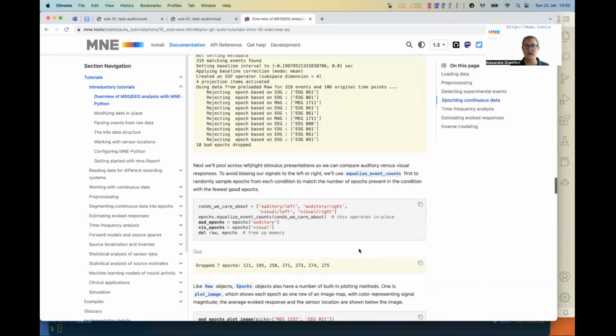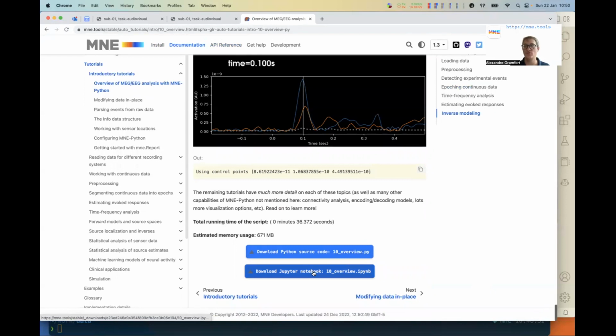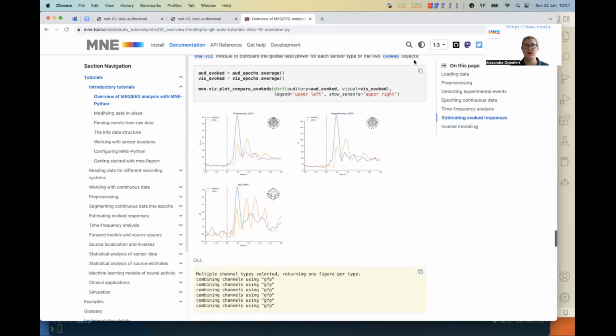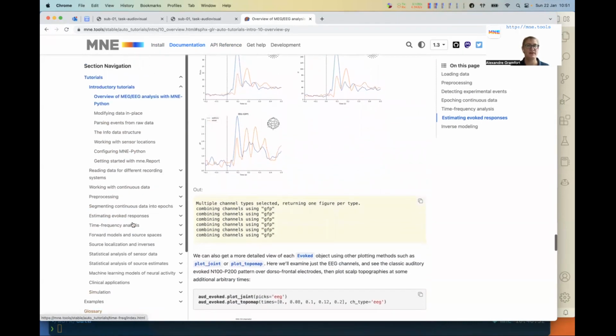But very importantly, at the bottom, you can simply click download the Jupyter Notebook. And if you download the Jupyter Notebook, you should be able to run it on your machine and replicate all of these images that you see in the notebook. The search is also working pretty efficiently. You can search for keywords or information in the web page, and that should orient you correctly.